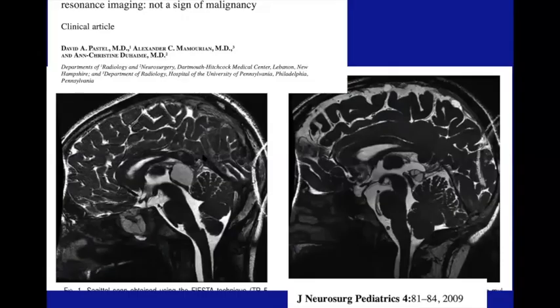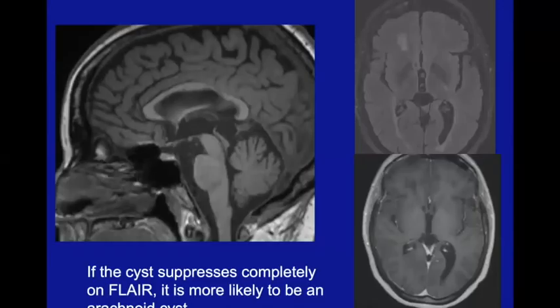Now, this is a paper we did on that. This is what you expect a pineal cyst to look like. This is also a pineal cyst, maybe not what we expected it to look like. So be careful. Many of these normal pineal cysts that on low resolution imaging look like simple cysts are actually fairly complicated and septated on the imaging. And that, I think, accounts for the appearance that I showed you, that case that went to biopsy with the pineal cyst that probably didn't need to be biopsied.